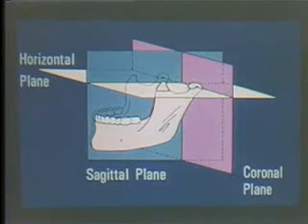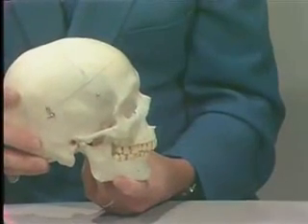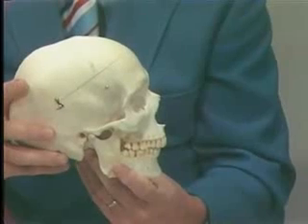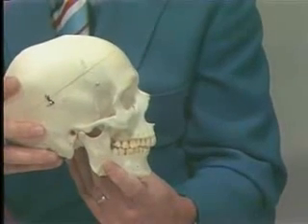And we'd like to demonstrate now the border movements, Posselt's border movements in the sagittal plane, and then we'll do this with a schematic drawing, and at the same time relate the movement of the mandible to show you the envelope of motion that we have.